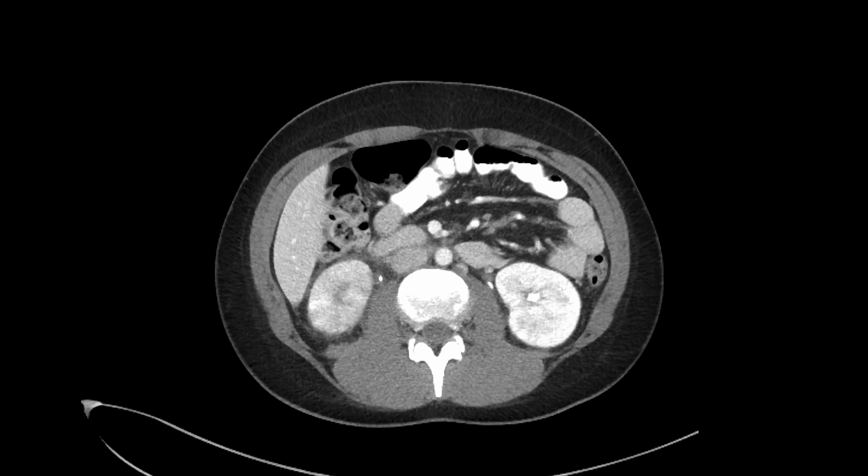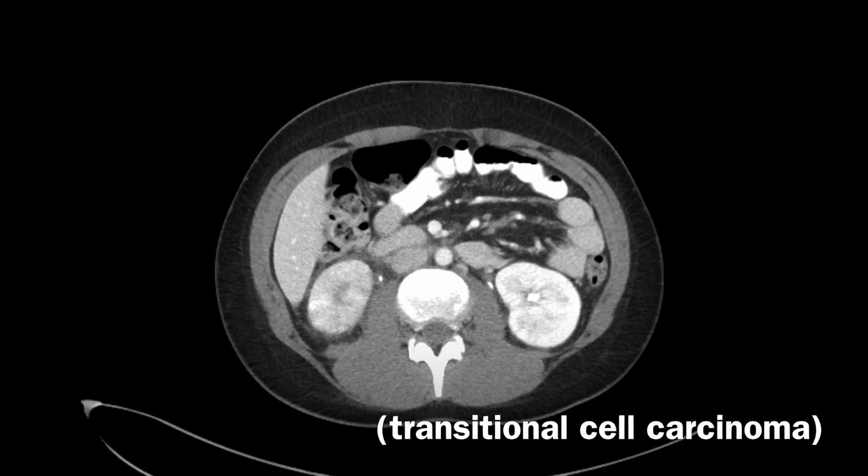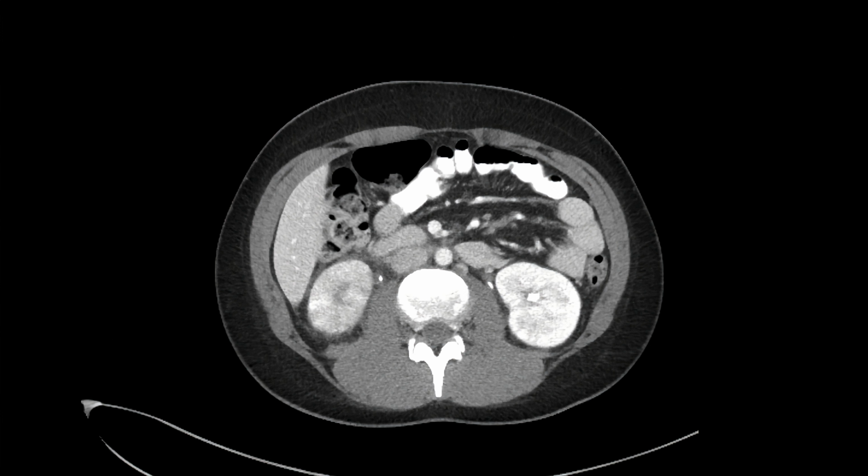Some of the reasons to perform delayed phased imaging, or imaging where you fill the collecting system with contrast, include looking for cancer of the collecting system. For example, if the patient has a history of TCC and you're looking for a recurrence, or if you're looking for injury to the collecting system, like in a trauma, or say a gynecologist may be worried that they may have nicked a ureter.